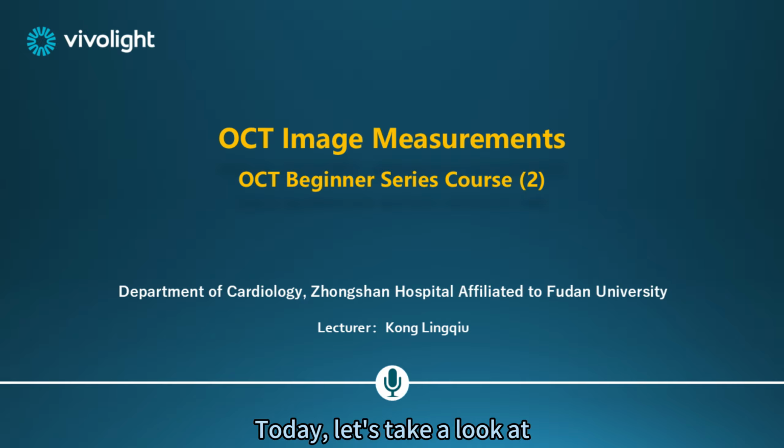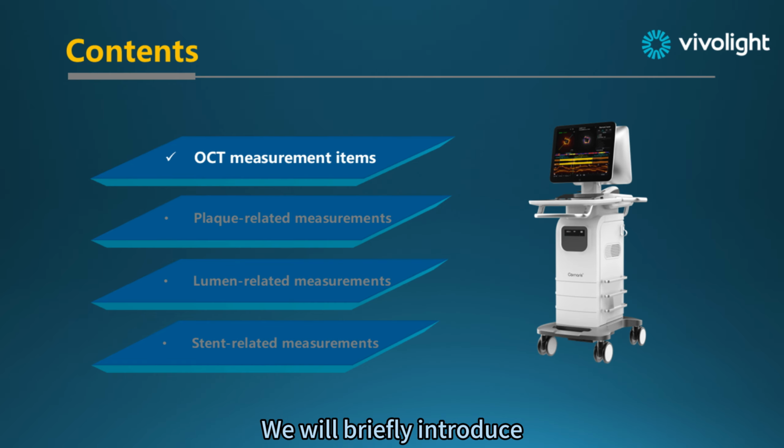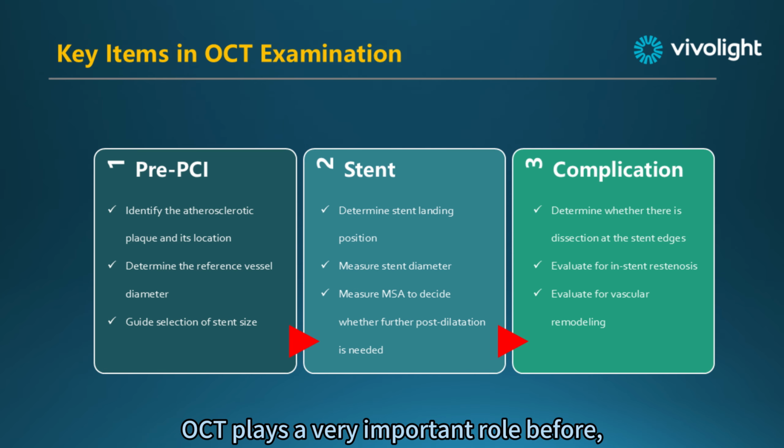Today, let's take a look at aspects related to measuring OCT images. We will briefly introduce the following 4 areas. First, let's look at the content of OCT measurements. OCT plays a very important role before, during, and after coronary interventional procedures.